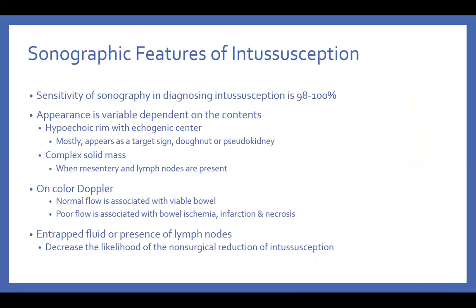So what are the actual sonographic features? What are the features of intussusception? Earlier I told you, if it's there, you should not miss it. The sensitivity of sonography in the detection of intussusception is nearly 100%. So that's why it's very important, as I told you earlier: if it's there, you will find it.